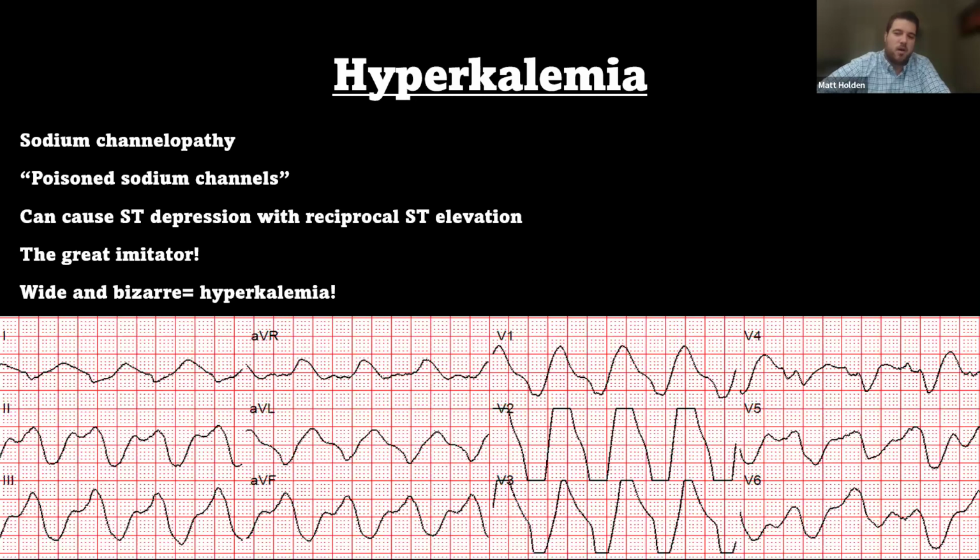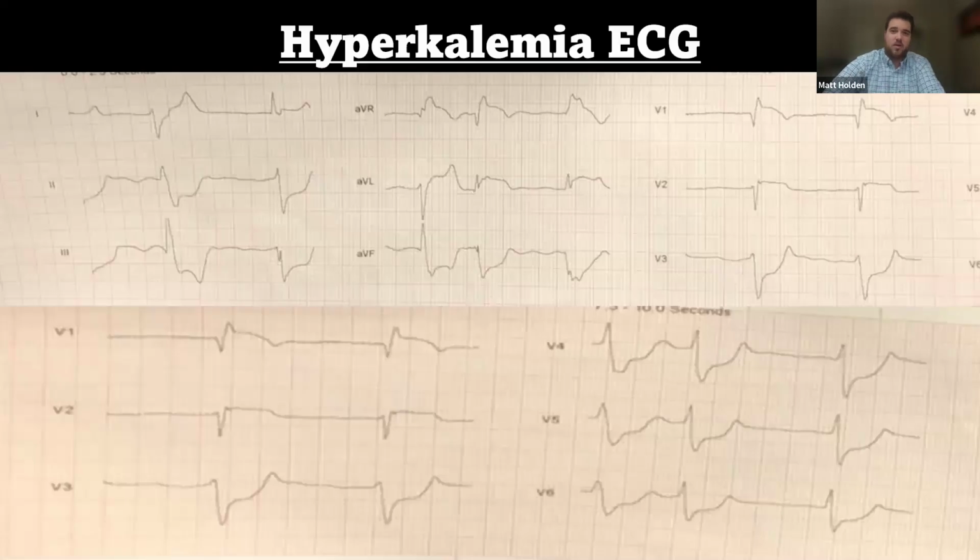You see it's over 1 big box wide here. And when you see anything that's over 1 big box wide, the QRS, you need to start thinking of any kind of tox or metabolic problems. But we're here to talk about hyperkalemia mimicking a STEMI.